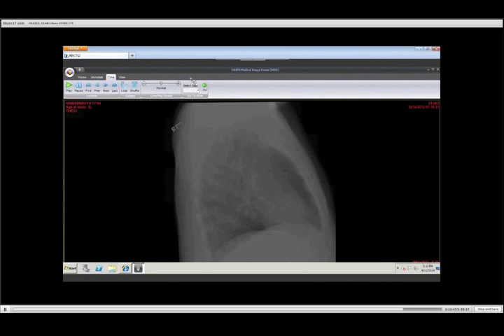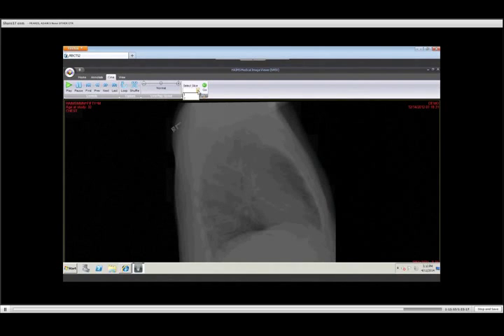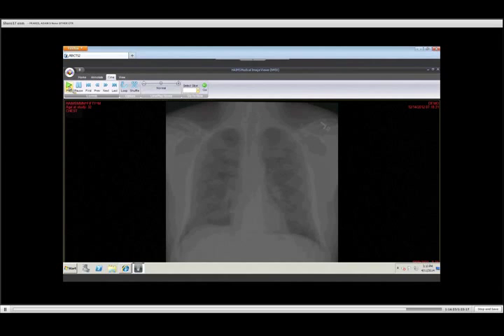On my Cine tab, if I go to my Select a Slice, you'll notice that I only have 2 slices. If I had a series that was pulled up in the HMIV and it had 80 slices, and in the radiologist report it said slice 67 has a fracture, I could literally click the Select a Slice, scroll down to number 67, and just click it and go right to it. This is like a DVD player. I could hit play, and it will play all of the slices.